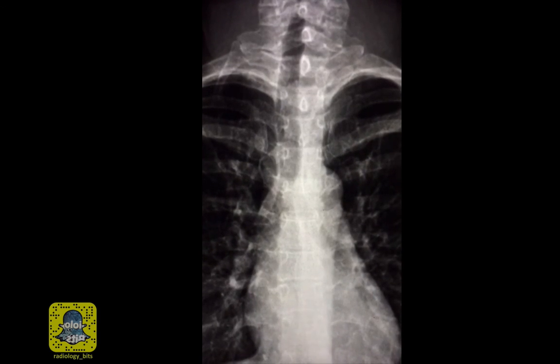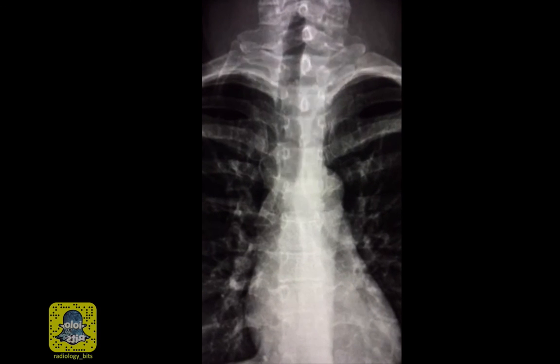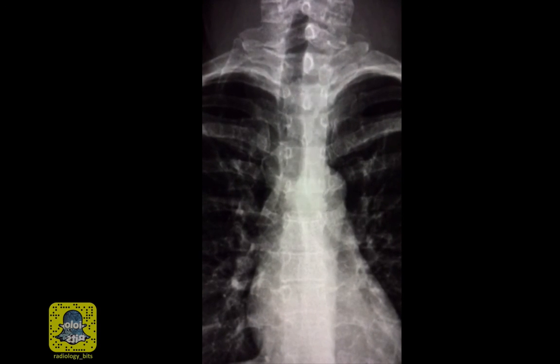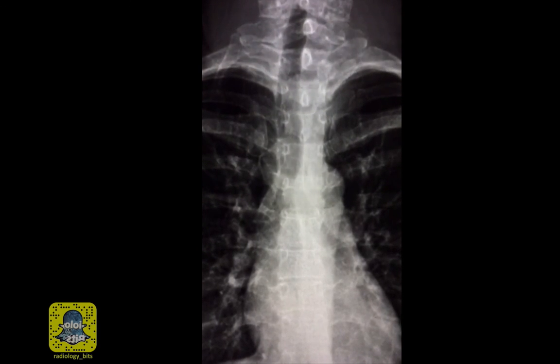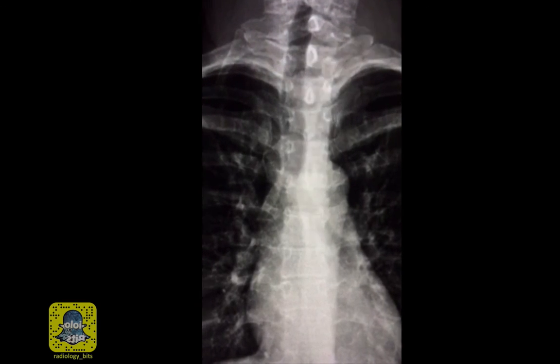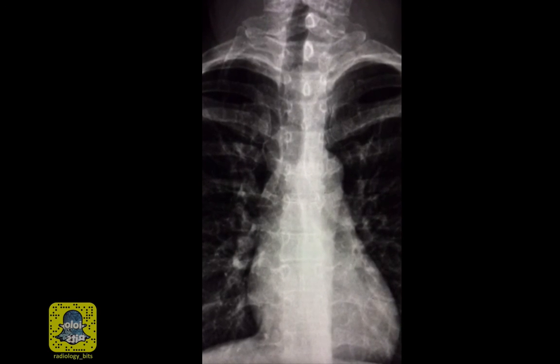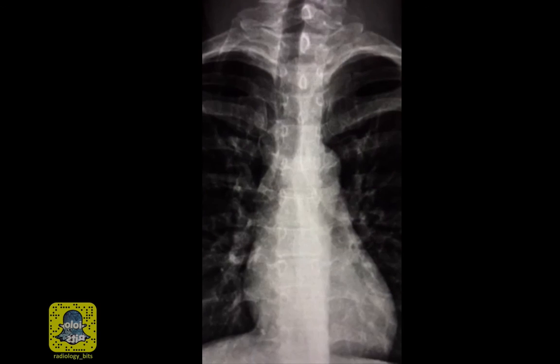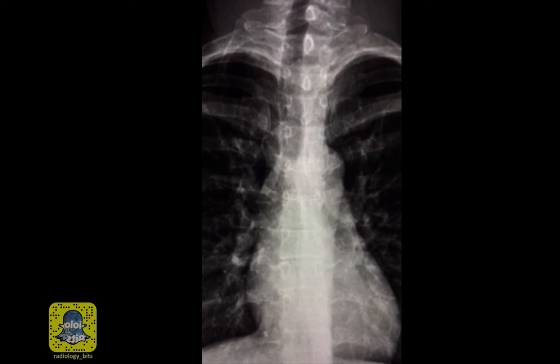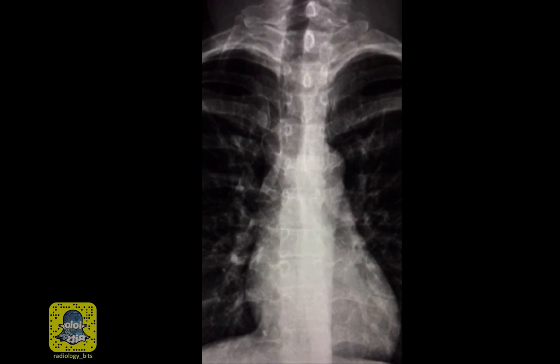Knowing the direction of the transverse process of the vertebral body helps you confirm whether what you're looking at is a cervical rib or not. The transverse process of the thoracic vertebrae points upwards, and that's why a normal rib creates an angle when it arises from them. That's compared to the transverse process of the cervical vertebrae, which point downwards, which means a cervical rib would have a continuous, smooth downslope from the transverse process without creating an angle.